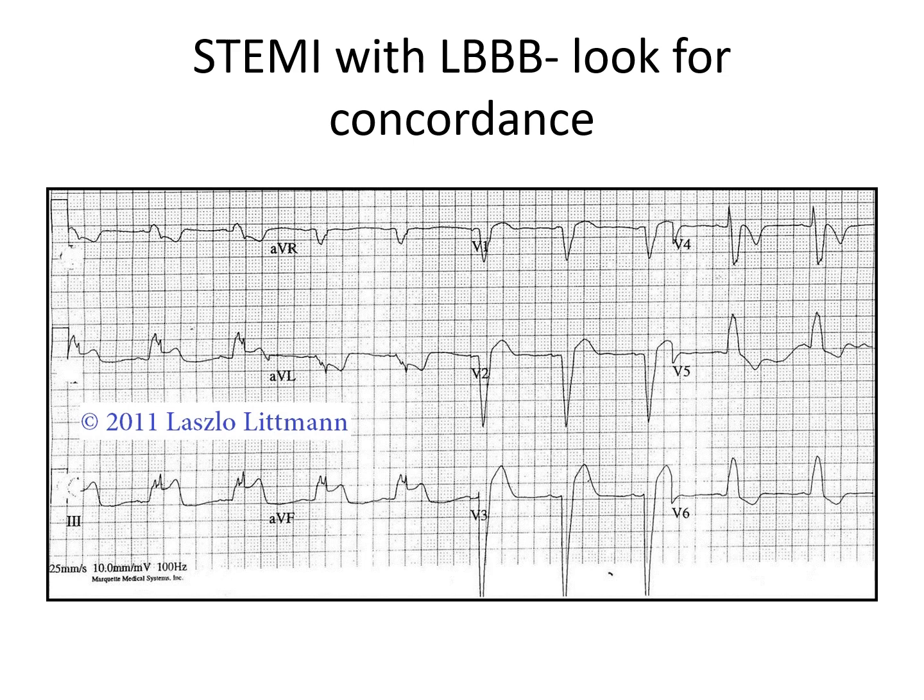Look at lead 3, for example. That's a very good example of inappropriate concordance. The QRS is upright in the presence of a left bundle. That should mean that the ST segment should be negative. However, it is elevated here. Again, look at lead AVL. It is negative. That means that the ST segment should be positive, and in fact, it's depressed.